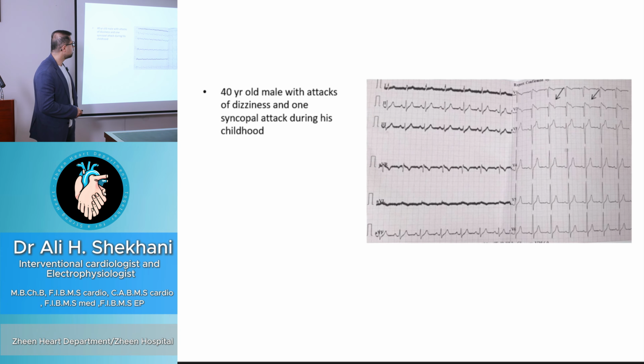And this is another patient, 40 years old, with attacks of dizziness and syncopal attack. It is a classical ECG finding of Brugada syndrome. ST elevation is just in V1, V2, and it is coved-shaped. So this is a Brugada.